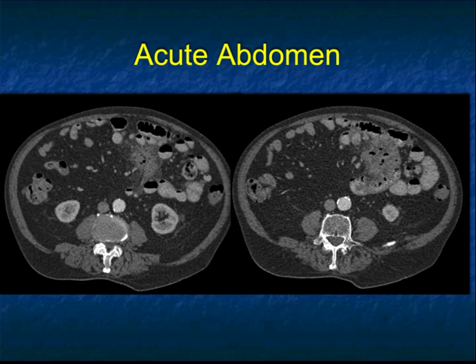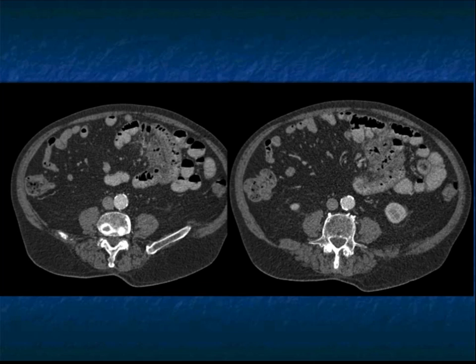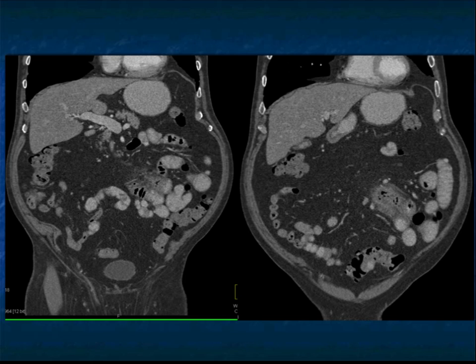You see what looks like an inflammatory process in the mesentery, and there are multiple tiny air bubbles here. This is the appearance of diverticulitis. Now, we always think about diverticulitis in the sigmoid colon or the colon in general, not the small bowel. Well, small bowel diverticulitis can occur, more commonly in the jejunum and ileum. It often presents as a mesenteric inflammatory process, simulates perforation, is typically treated conservatively, and the patient will do well.